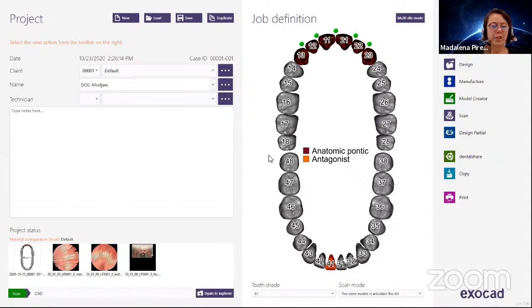So we have the initial jaw with the axial orbital plane, the Camper plane, and the occlusal plane. Those three files are going to be a big help, and we're going to keep them individually. I'm going to say okay, and as you can see, they're perfectly matched, all in the same position. And when I go back to the wizard and start the virtual articulator, you will see that the data is already perfectly positioned in the virtual articulator in Exocad.